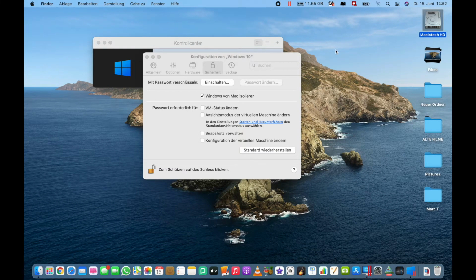And when you then try to run ActiView, it will return a myriad of messages saying, I can't find the VI file here, I can't find that VI file. So all the VI files are hidden on another drive, on the Macintosh drive, and that is because you're not isolating the Mac from Windows. So putting a click here will isolate Mac from Windows and will allow you an installation and running ActiView just like on a normal PC.